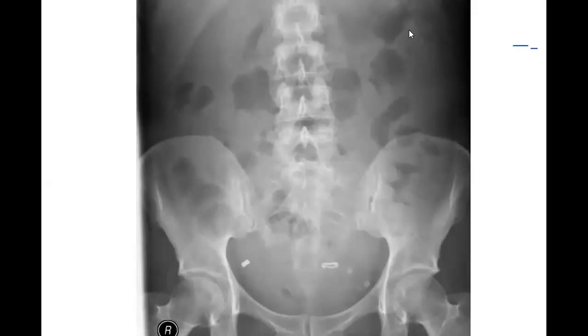It is important to check the gas distribution of the bowel, that it is a good distribution, and also to check if there is any narrowing. For example, here you can see the gas bubbles in a good way. If you check this one also, it will be good. But when you reach exactly above in this area, you will find that the descending colon has colitis. So there is colitis.